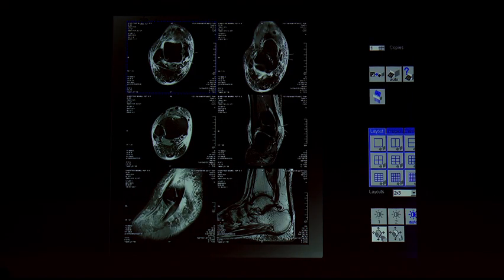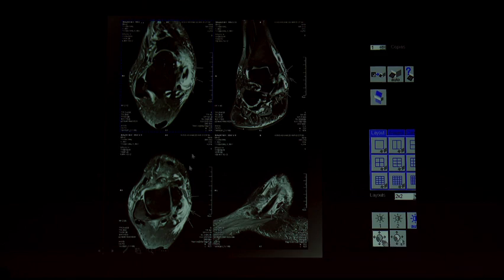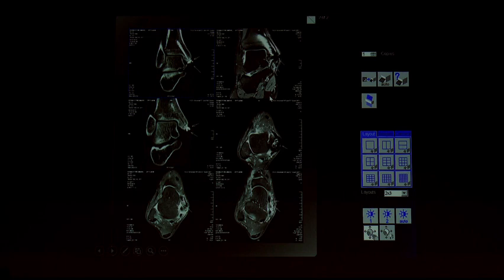What are the abnormal things that can occur with the medial tendons? Medially, we can have a tear. This is the classical appearance of tibialis posterior tendon tear with tenosynovitis. You can see it adjacent to the medial malleolar region. You can see the large tear in the medial malleolar region, and the tibialis posterior tendon has gone for a tear. And you can see a rheumatoid arthritis patient with the typical appearance of bony tubercle projections from the posterior aspect of the medial malleolus, and you can see it has gone for continuous irritation and tear of the tibialis posterior.